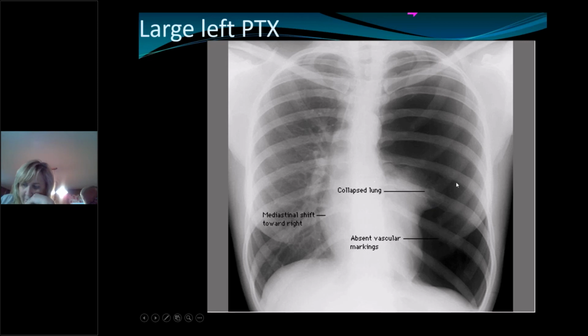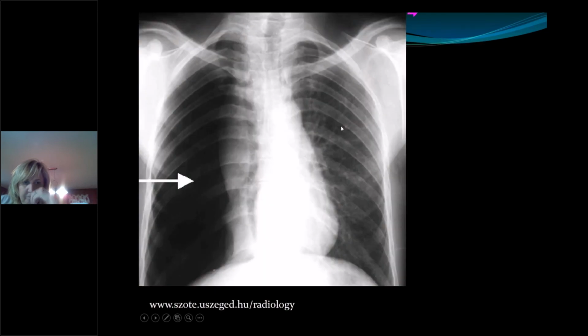So that lung has been compressed from out here all the way into this, and this is a huge pneumothorax. So when you come in, you put a chest tube in here and you let all that air out, this will then re-expand up and out. So this person has a massive, actually it's a tension pneumothorax because it's so huge. And we actually can see the trachea shifted laterally to the right as well. So there's a good example of a tension pneumothorax.